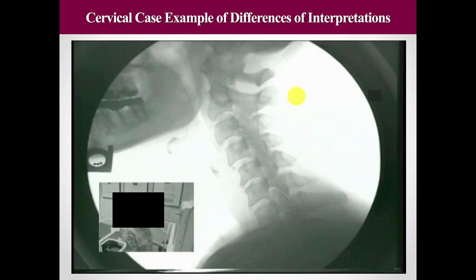It really is. So what I want to do is exemplify what you're going to see clinically in practice. And I'm going to use a DMX on this one, which obviously PostureRay does. Now, what I want to show you is where I think the AMA Guides makes a tragic error using the 5th edition. Okay, so in the static position, you can see this is a significant spondylo, right?